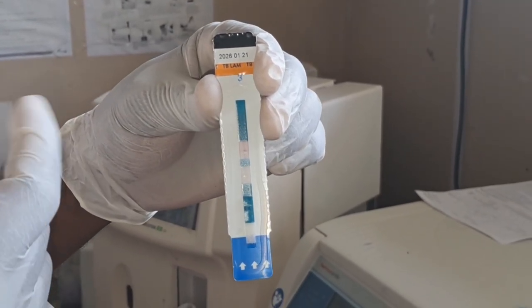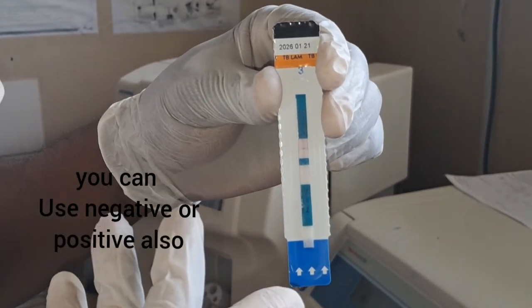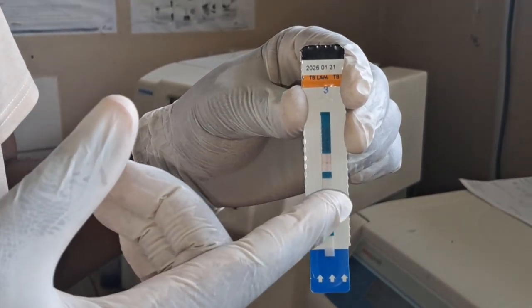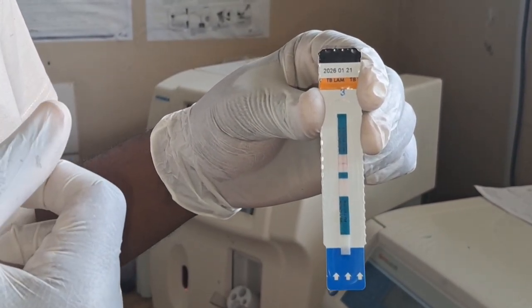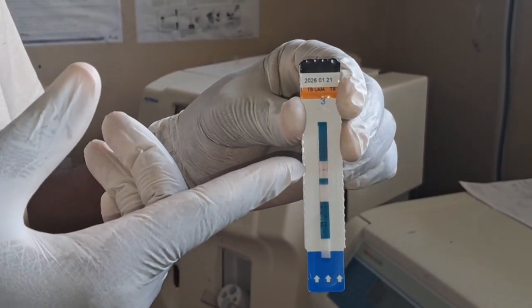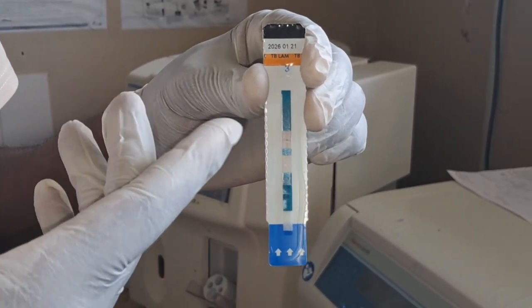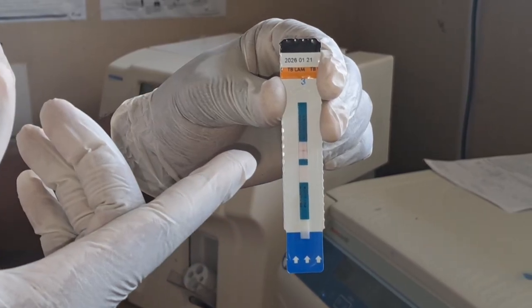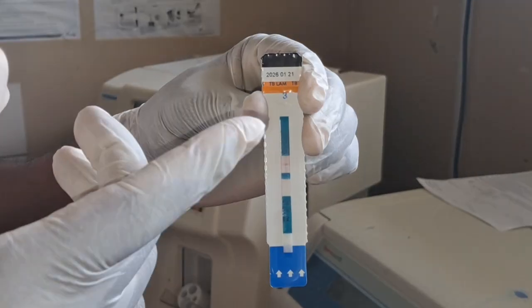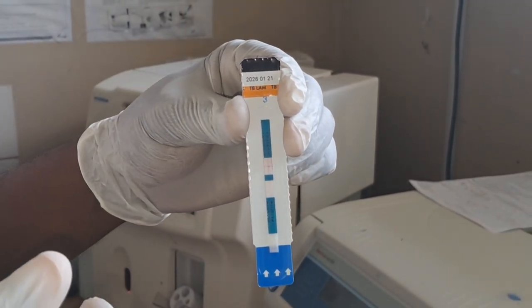That will show that the test was reactive. Let's also assume that the control line was absent and the test line was present. That will show that the test is invalid. As I said earlier, the control line validates the test. So if the test line comes out and the control line is absent, that's an invalid test. If it comes out blank, with no lines, it's also invalid.